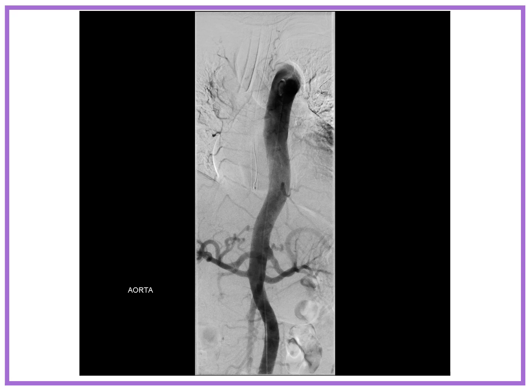Why? This person is going to have a big fusion, and our surgeons are cognizant of the fact that big fusions with not exactly straightforward spinal osseous and muscular anatomy are a potential setup for injury to the anterior spinal axis, or the contributions to the anterior spinal axis, more likely at the radiculomedullary level. And so that's what we're asked to do, to map out those contributions.